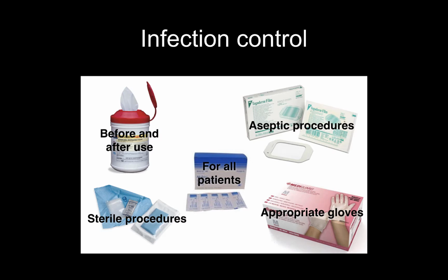The Sani-Cloth Plus wipes, which are found in the red top containers, are appropriate to use on our machines, but be aware that any bleach-containing wipes can damage the probe, so please don't use any bleach-containing wipes when cleaning the machine.